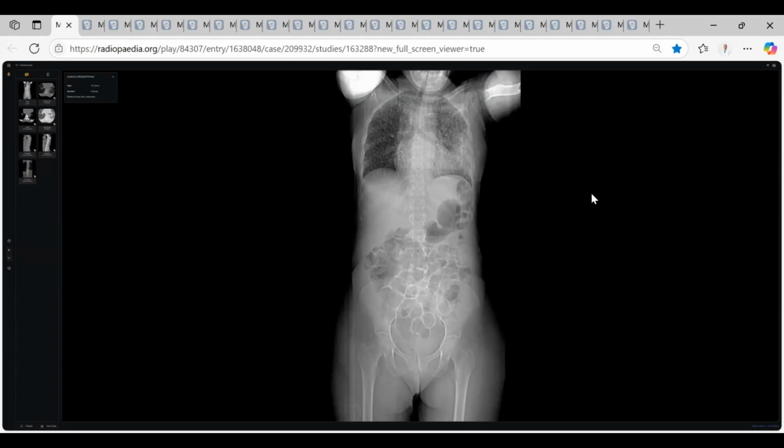What happened to both lungs? What type of pathology here in this scout? This area of dense opacity, I am thinking of consolidation, sir. Okay, but here, leave the mouse. What happened here? Is this normal for you?